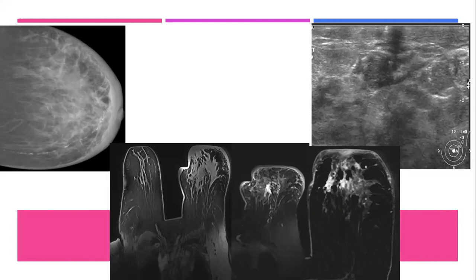Okay. But suspicious for which type? Special type. When the skin is involved and enhanced, that indicates that the skin is being involved. And if you look here, you see some tubular structure, vascular structure going into the skin, enhancing with adjacent more enhancement.